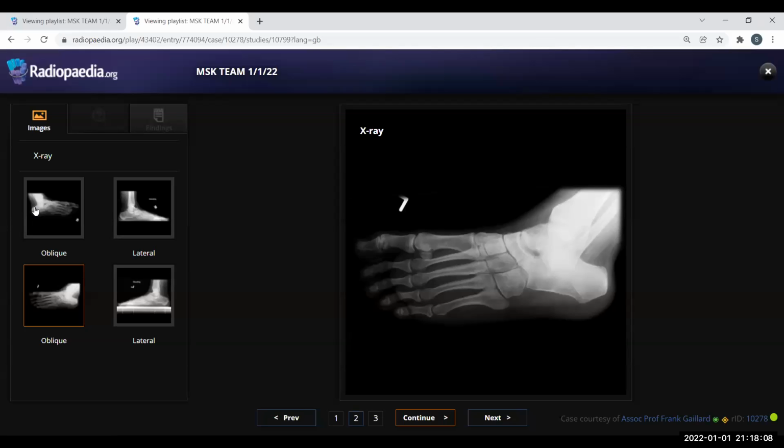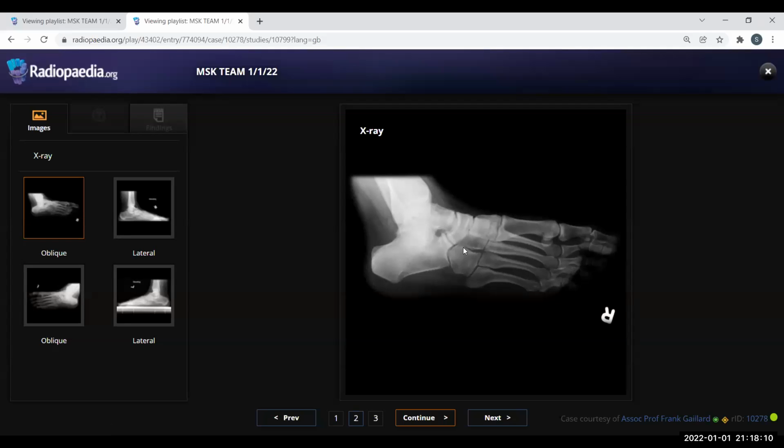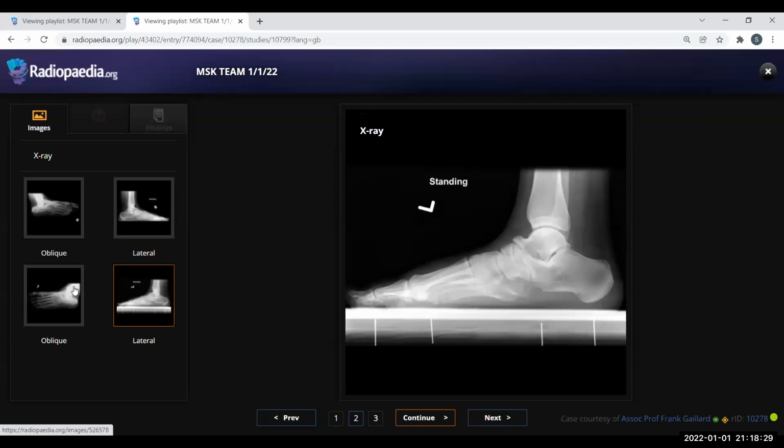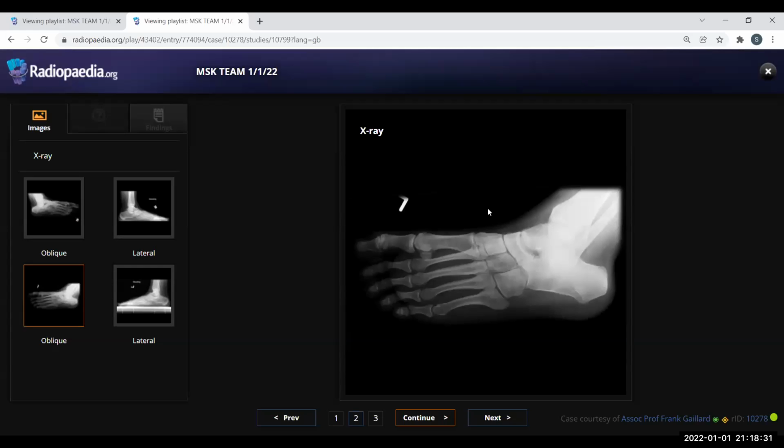Okay, so describing it during the exam would be nice, so that the examiner would know that, of course, you have said that this is calcaneonavicular coalition, but just describing it, saying that I can see that there is narrowing of the calcaneonavicular articulation with sclerosis in the periarticular region, and there is talar beak bilaterally. So hence, this is a case of bilateral calcaneonavicular coalition. Okay, well done again in this.